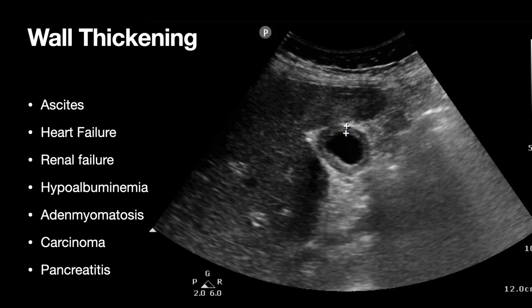The other one that I didn't have on this list, but it's important, is a contracted gallbladder wall, right? Because if you have a contracted gallbladder wall, that will also appear a little bit thicker than normal. And so again, if you say, I have just thickening, this has to be cholecystitis, you have to use a little bit more clinical intelligence in that one, and incorporate it into the whole broader picture, right?